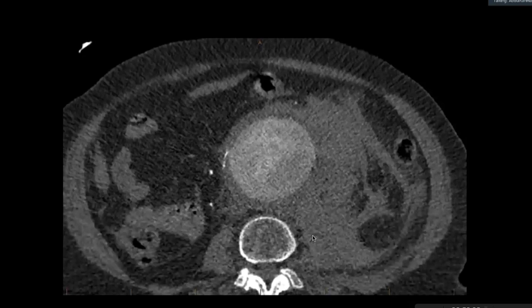You do not need any further views, and you did very well to say to involve the IR or the vascular surgeon. You could say urgent vascular referral is required rather than IR. This requires vascular referral, as IR does not occur in every hospital. Very well done. Now, can I ask you a question? Did you know what this was as soon as this went up? As soon as I displayed the film, did you know what the answer was? You knew this is a ruptured aneurysm, right?